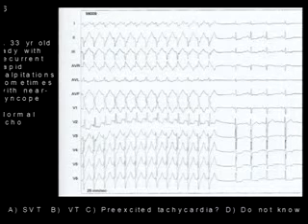Dr. Green, you want to make a point? Can we go back to the ECG? One of the criteria that we use, actually almost all of the criteria we use to differentiate SVT from VT, has to do with the morphology of the QRS, and the morphology really has to do with activation through ventricular muscle versus through the Purkinje system. Idiopathic VT unfortunately doesn't meet any of those criteria because it's activation through the Purkinje system.